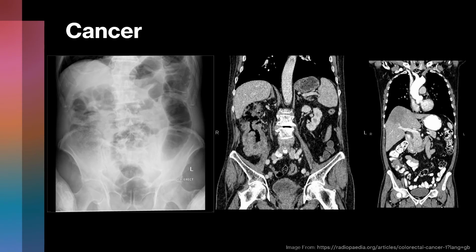So cancer is another cause of bowel obstruction, and this can be directly secondary to colonic cancer or indirectly in the form of omental metastasis from other tumours such as ovarian cancer. When presenting the radiograph, report all the main findings and suggest a CT to further evaluate, remembering to recommend a chest CT for staging if you're suspicious of malignancy. This may also be followed by a PET scan if required.